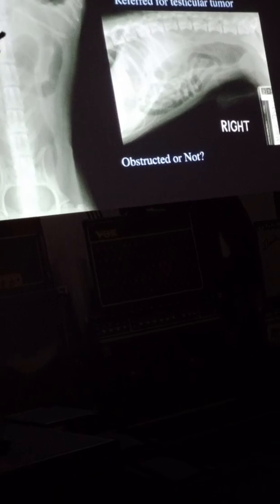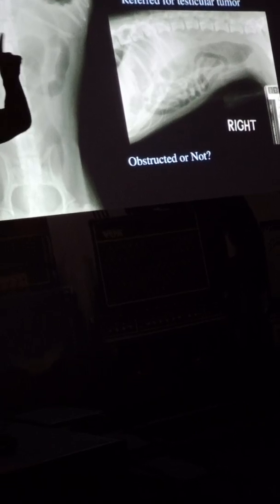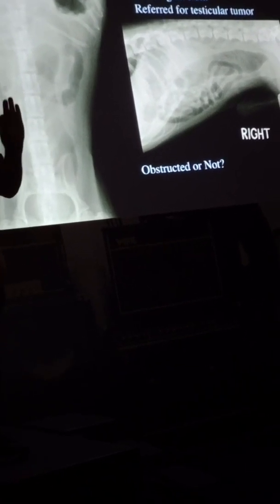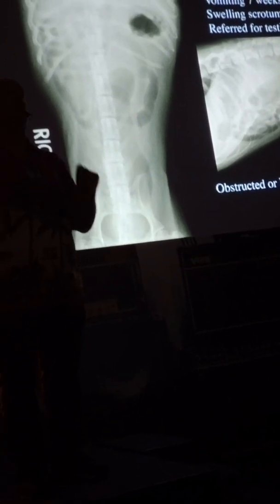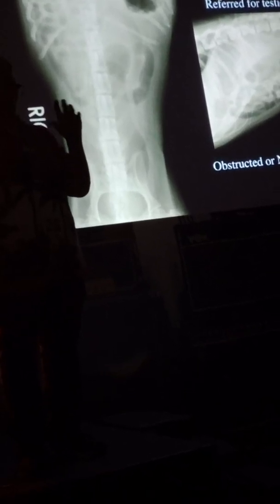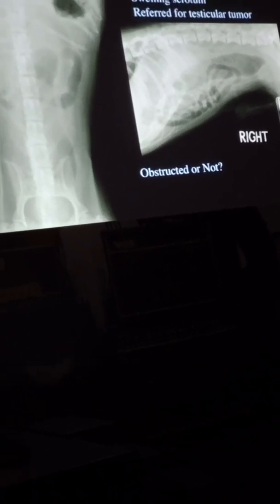Yes, it can. Great question. But this is a male. If he were a castrated male, he's a male. He's intact. Most of our prostatic tumors are in castrated male dogs. We see tumors in the prostate far greater in castrated male dogs, and they're usually not massively enlarged. The classic appearance is mineralization in the prostate that's enlarged in a castrated male. So good question.